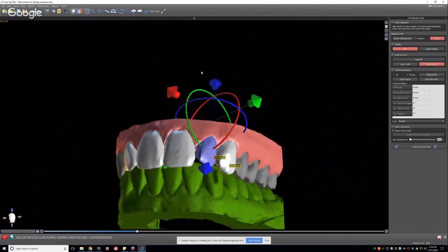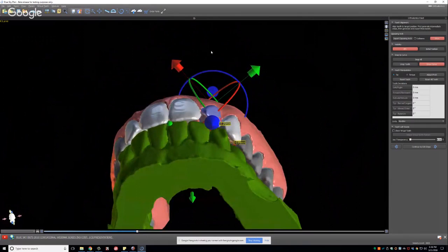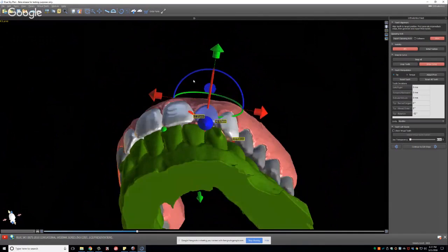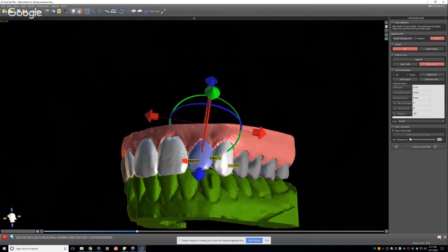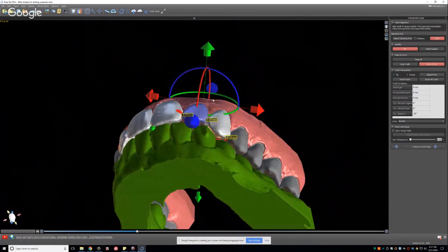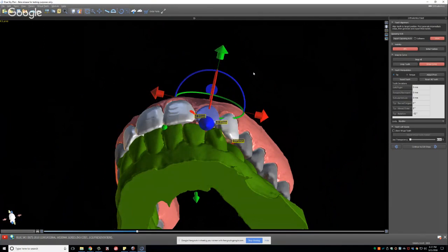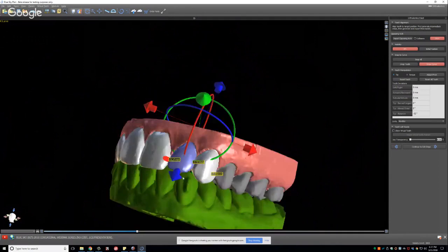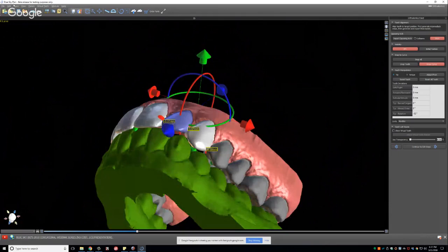But keep in mind the kind of movements you're trying to do with teeth, because when you start torquing roots is when you start having much longer treatment times. And that's okay if that's what you need to accomplish, but it is something to bear in mind. Now, another thing I skipped mentioning, but it is important, is IPR calculations. That was not active in the last webinar. And so now you can see active IPR calculations, and you can determine what is appropriate.